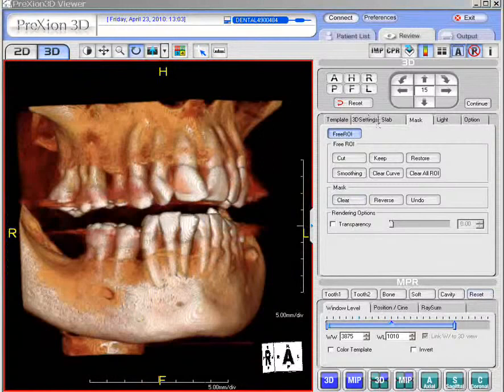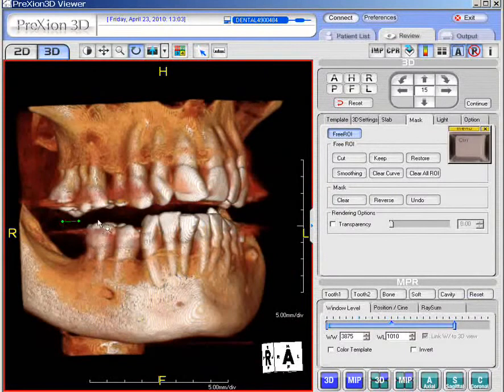Another method to cut away is by holding the control key down instead of the shift key. If you hold the control key down, you're going to get what looks like a little light bulb with the arrow. Just click the dots, spread them apart a little bit, and one could be perhaps a little more precise if you wish to cut away a section.